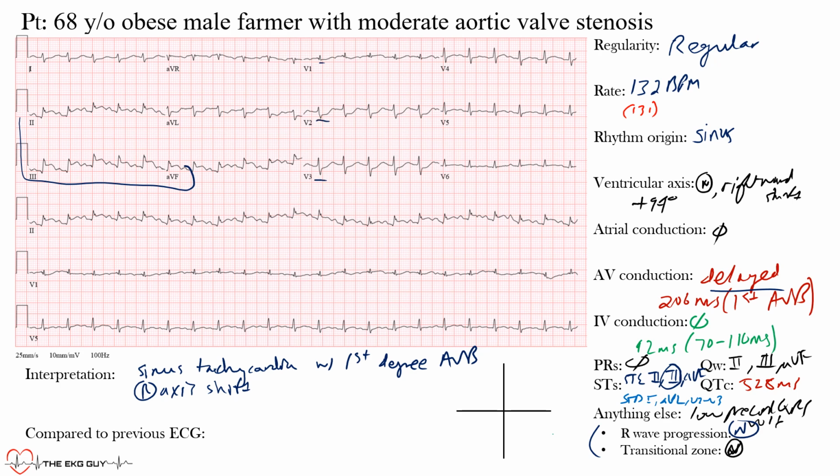Okay, and what this actually points to is that this patient likely has an inferior MI, myocardial infarction, presumably acute actually. Okay, you have ST elevation going on in the setting of developing Q waves, okay, with reciprocal changes. So I would say this is an inferior MI. That is acute, but I'd also say this is probably a posterior inferior MI.